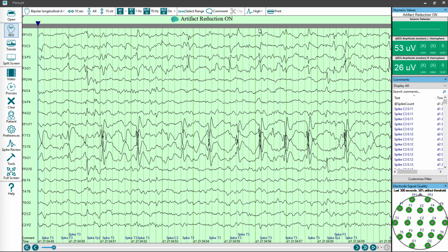They tend to focus less on variability from one to the next, and the algorithm is a little more consistent about, well, I'm going to call this a spike and that not, because of slight differences in perception value. So by going to high, it pretty much smooths that out. These are so clear cut that going to higher medium is not going to make much of a difference. But for this, we're going to set it to high for doing those spike wave index counts.